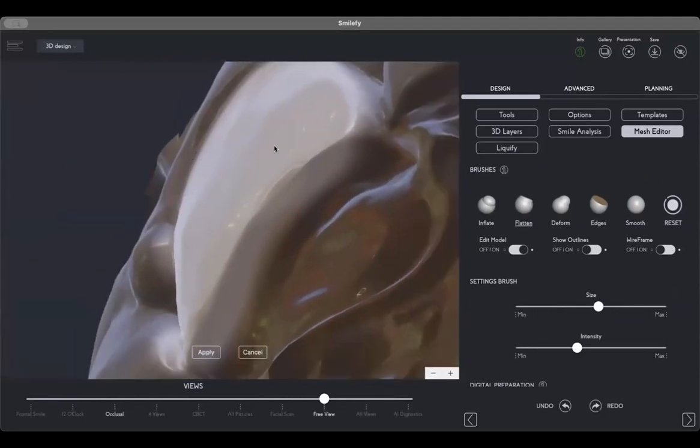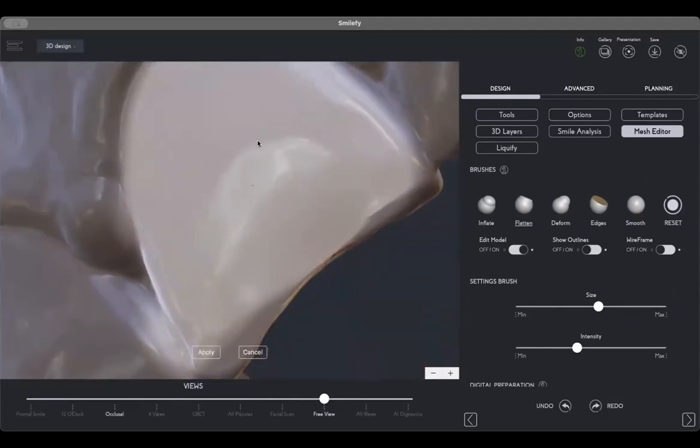And now when I design on top, if the patient comes back into the office and you take the composite veneers out, you already have the design. So you can create a new silicone key, create temporaries for the patient, and they go home with the same gingival margins, a new design, and done.